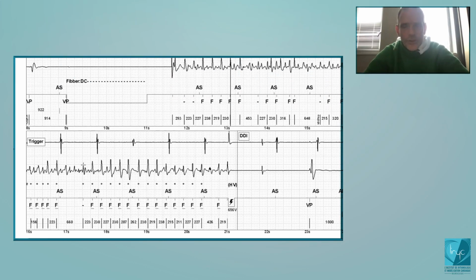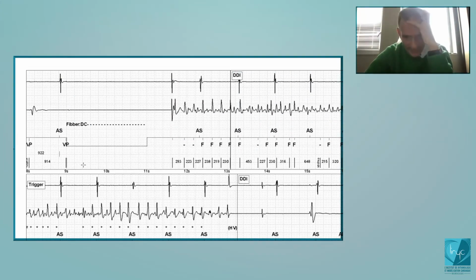Okay, so this is the reason why this manufacturer has chosen this way of labelling the cycles. When you compare the current interval with the average value, the idea is to say, okay, what I want is 100% sensitivity in case of VF.